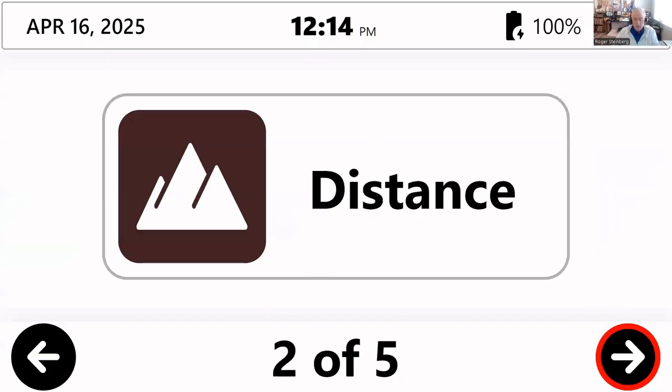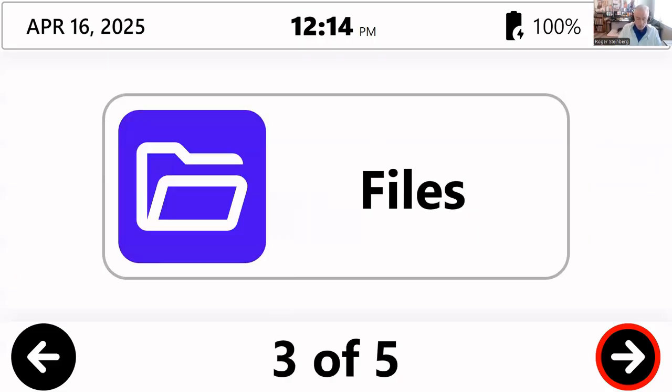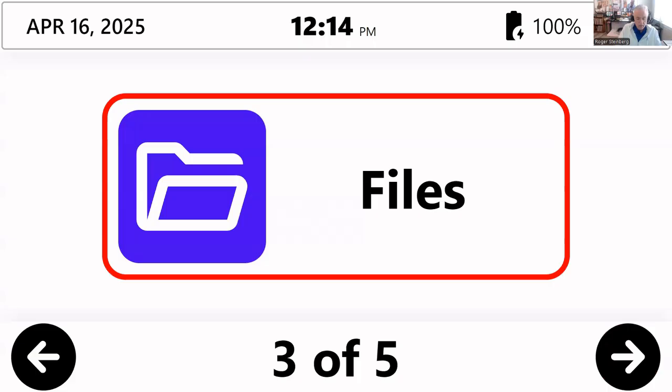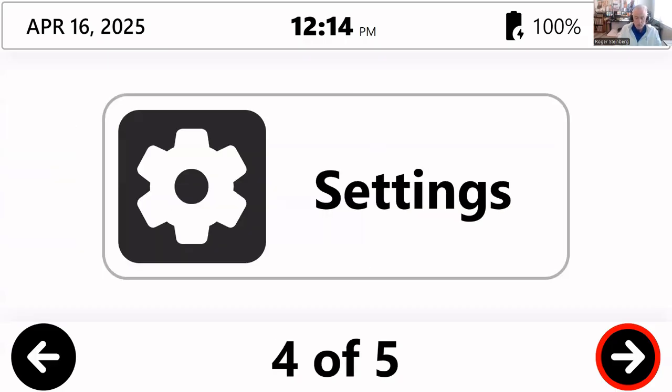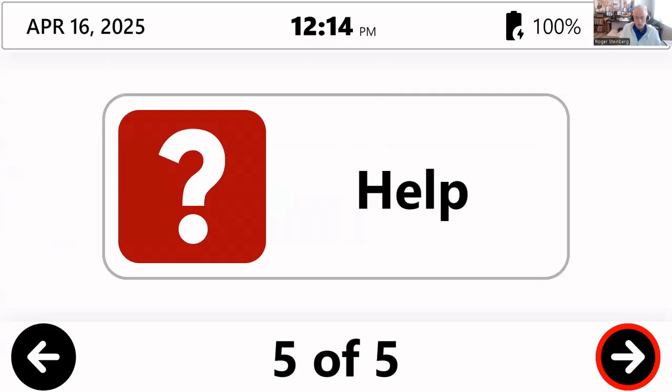So I'll tap here. All of this is touch sensitive. My laptop does not have touch capabilities, but I can use the icons at the bottom to navigate, and they are also navigable using my keyboard. So I can use my arrow key or my tab key on my keyboard to navigate through the different functionalities there, and then hit my enter key to activate each of them. So let's enter one more time. So those are the 5 pages of my carousel there.